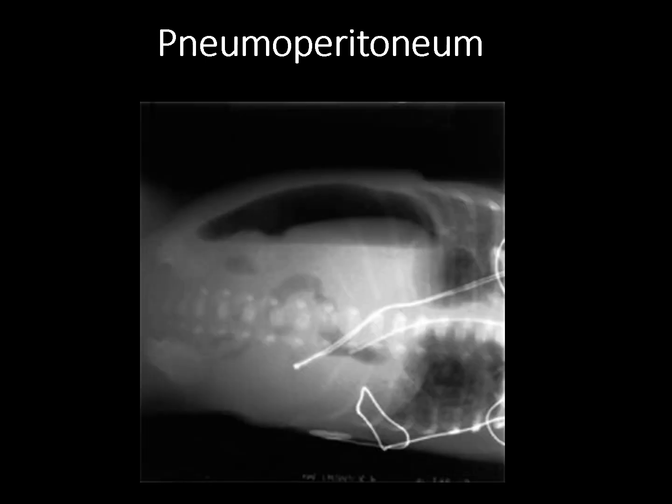We don't have to have an upright chest radiograph. It is the most sensitive, but any plane that's orthogonal to gravity will have a good sensitivity for picking up pneumoperitoneum. So the other one that's most common is the left lateral decubitus. So the patient's laying on their left side, and the air will float antidependently over the surface of the liver and against the abdominal wall.